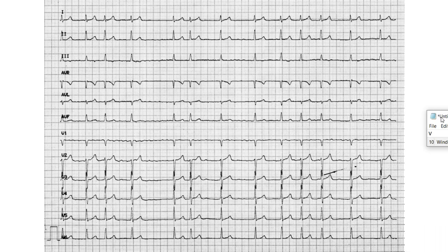So I'm not even going to do this. This is irregular off the bat. I'm not even going to move a finger. This is irregular. Heart rate, is it sinus or not? Well, I don't see P waves. Some dots here, I don't think they're P waves. In lead 2, I see 3 jiggles over here, or a bunch of small movements here. I think that might actually be, guess what?